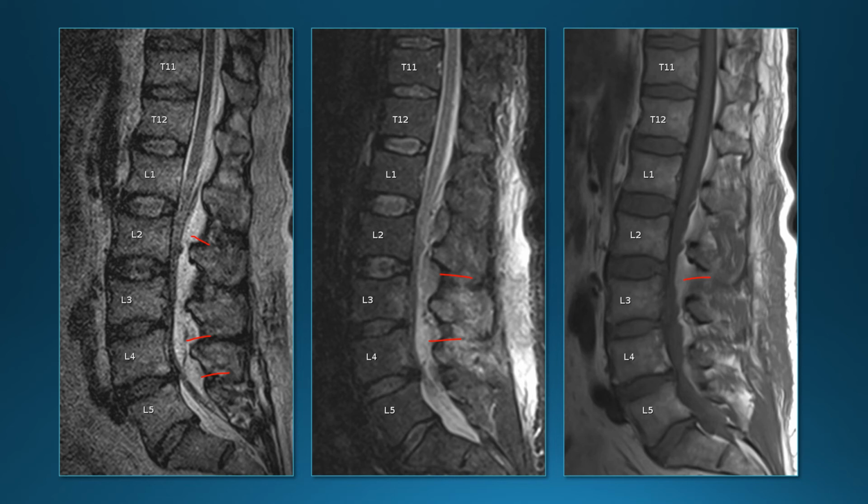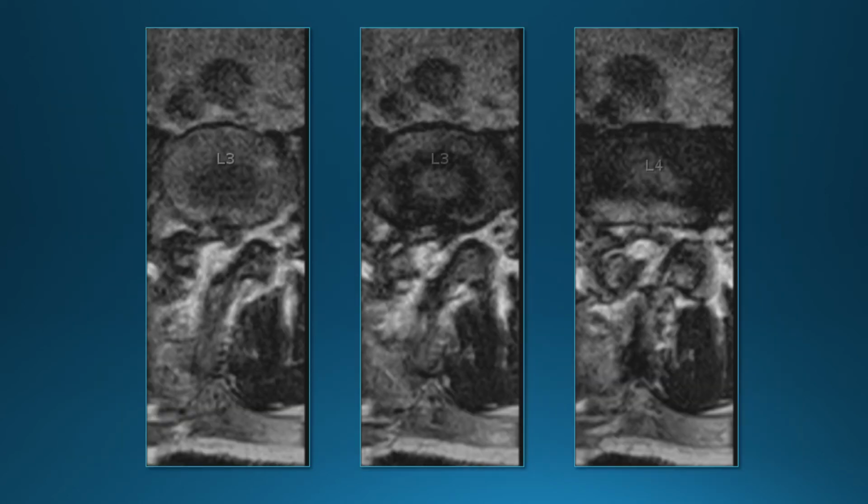And usually the postoperative abscesses don't develop until a week or two post-op. This was only a few days post-op. Usually in those cases we're dealing with an epidural hematoma. So in the differential for epidural abscess, always remember epidural hematoma. This was the axial image. We see this posterior epidural hematoma at the operative site compressing the thecal sac.